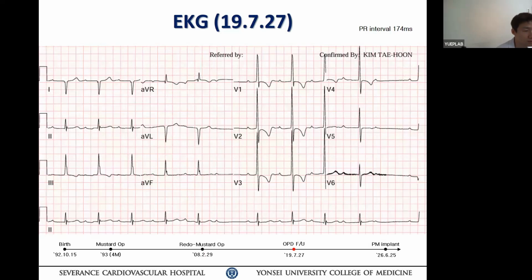Any fellow can interpret their AV node conduction status. Well, for this one, it seems to have a Wenckebach kind of pattern. In the first half of the ECG it's a bit difficult to appreciate, but after that pause, from the middle, yes, look at that PR. There's a baseline first degree AV block, but then it prolongs as you go on, and then there's a drop.